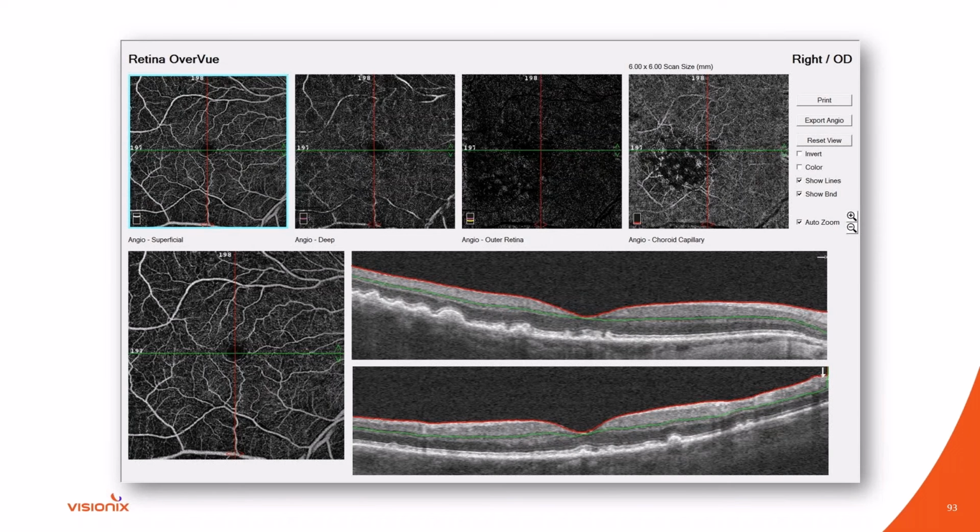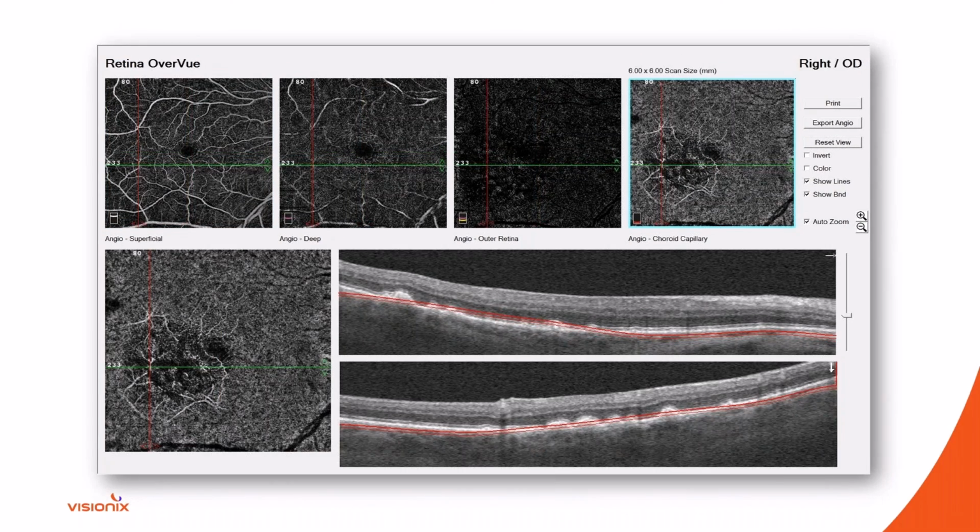This is, to me, the biggest utility of OCTA. You look at this and, okay, we've got a patient with clear outer retinal disturbance. We've got some drusen there. There doesn't appear to be any fluid. I need one more layer of confidence that there's nothing going on here. And you'll notice there are no blood vessels here, really nothing here at all. This has given me a level of confidence, going, okay, there's no CNVM at this point in time. There's no fluid in the retina. I feel confident and comfortable. I'll see this patient back in six months and we'll follow this closely. If anything changes, we'll act. So it really gives you that next level of confidence.